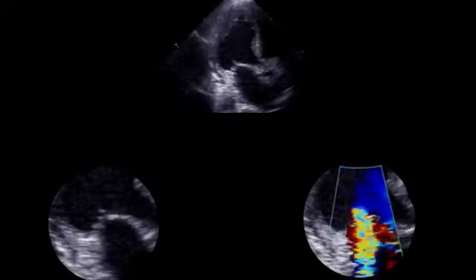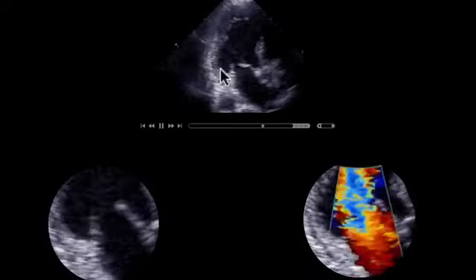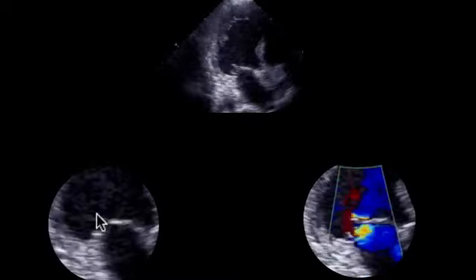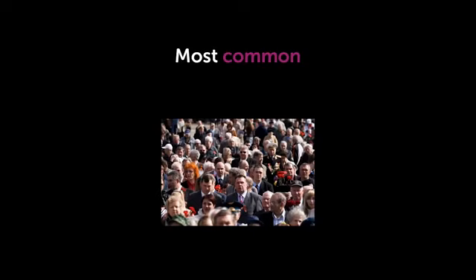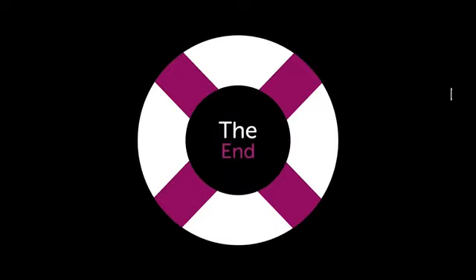One last example so that you recognize the pattern the next time you see it. Patient with posterolateral infarct, restricted posterior leaflet, you can see that even better here in the detailed view. Coaptation defect with significant mitral regurgitation. So this concludes the most common forms of mitral regurgitation, at least in my part of the world. I'm well aware that this is different somewhere else. Therefore, you will also see some more cases and some other causes in the fourth and last part of this echo survival course. So this basically concludes this lecture.